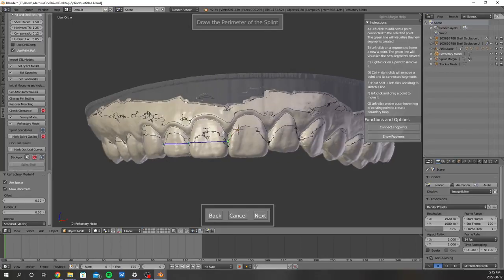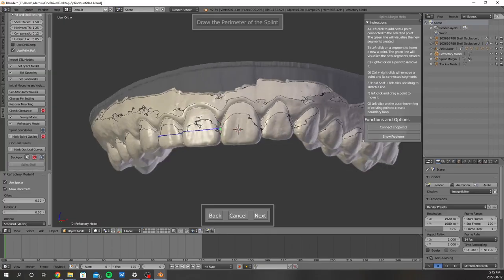One thing, if they have a space between their front teeth, sometimes it's a little bit goofy because this won't just automatically track across. It'll get lost almost. So instead of just clicking in the middle, you have to click here and then bring it down to the gums and then just trace it across. It'll figure it out, and when it prints, everything is totally fine.